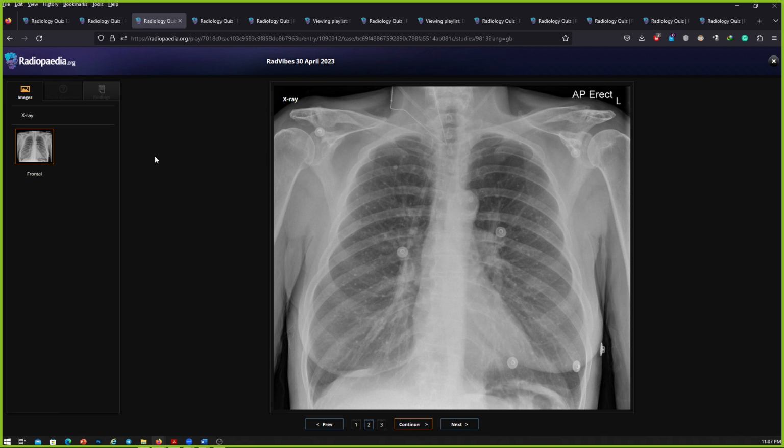So what are the causes of calcified lung metastasis that you know of? I think osteosarcoma metastasis causes calcified lesions. Also, mucinous cancers, like mucinous colon cancer, usually can cause calcified lung metastasis. Also, mucinous ovarian cancers can cause calcified metastasis, however, less likely.